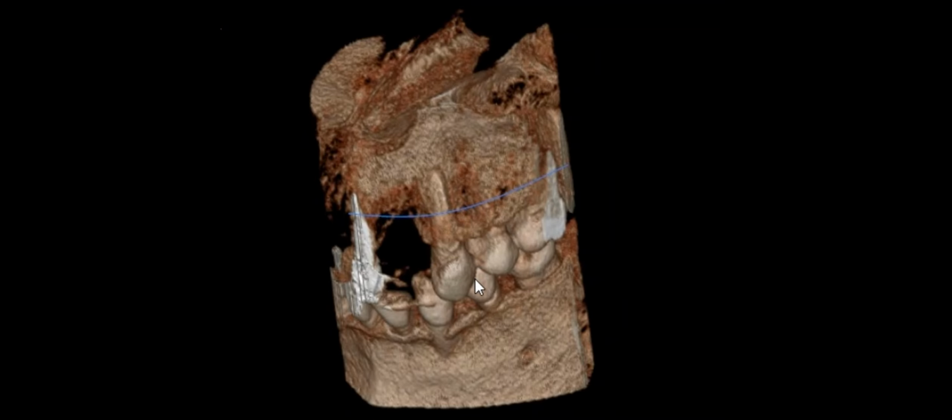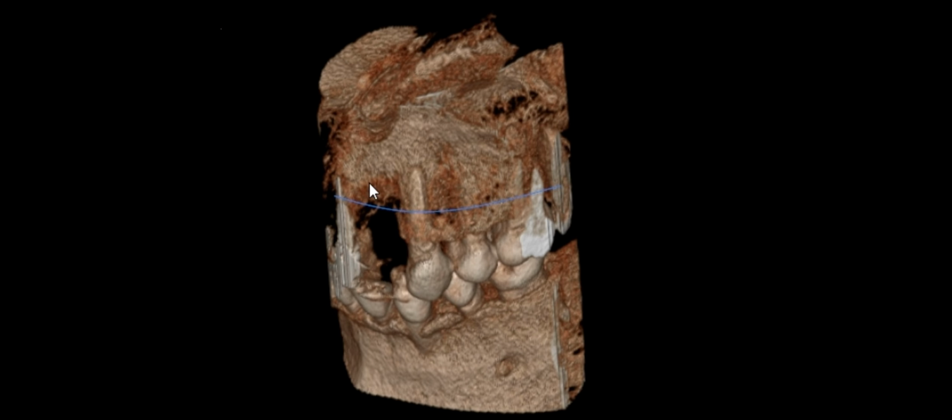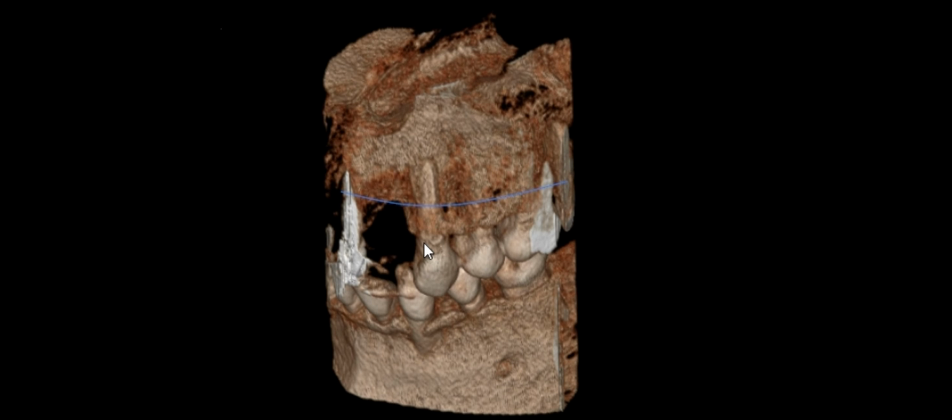Okay, it's 5 months after the extraction when this 3D X-ray was taken, and you can see the area has not healed very well despite 5 months having elapsed. This area here is still devoid of significant bone. The bone should run right across in this area here, and it's a massive defect where we need to graft in order to create a contour of the bone that is going to be reasonable once it's finished.